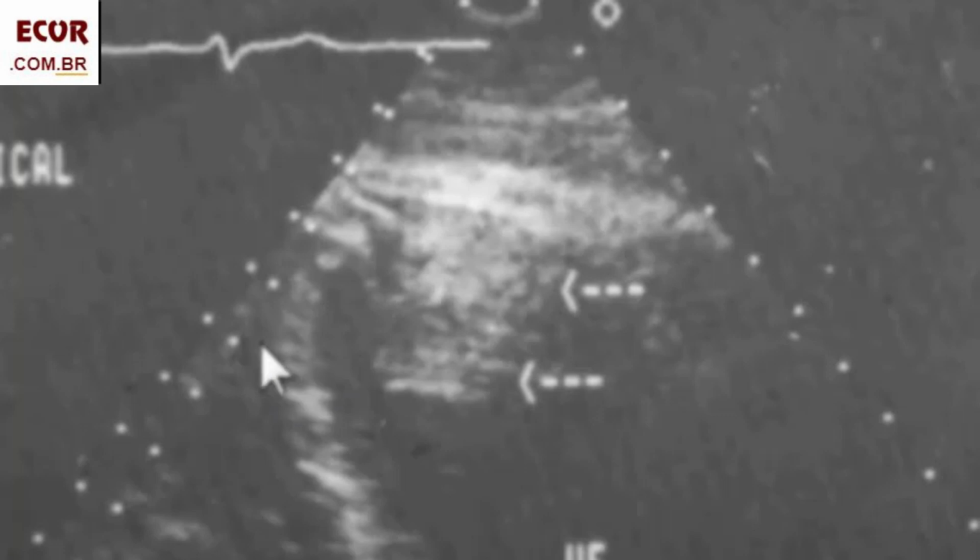But since this wall here is at the depth, and this reverberation is produced from this depth, here, closer to the transducer, if we change the position of the transducer, this reverberation will have a different displacement compared with this wall. In other words, when we move the transducer, this region here of reverberation will enter inside this wall, since it has an angular displacement different from the wall. This space shortens or widens, depending if we angle the transducer one side or the other.